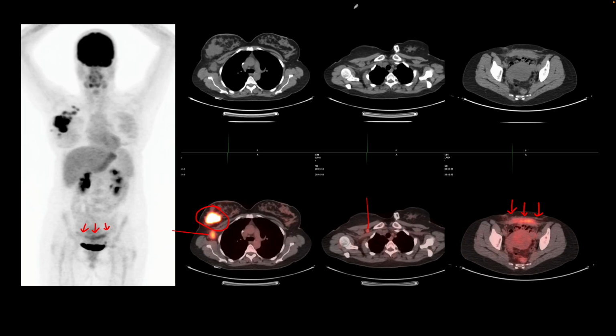The other incidental interesting finding is that we put a port in their left chest wall, but the port is standing on the side. This is the port or the base of the port, and that base should be touching the pectoral muscle so that it can be accessed for injection from this side. So its position has changed so that it is probably not accessible and needs to be addressed.